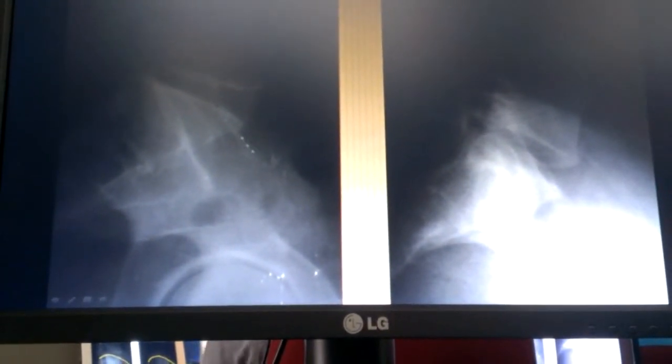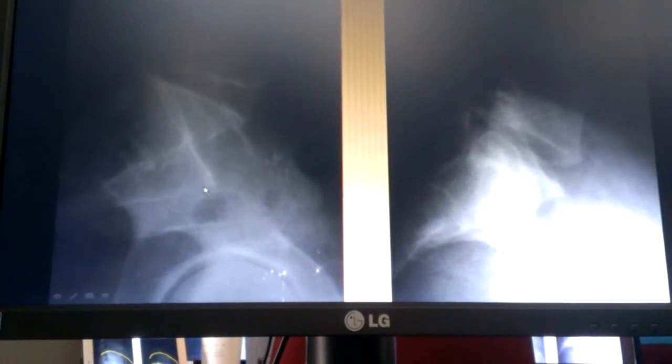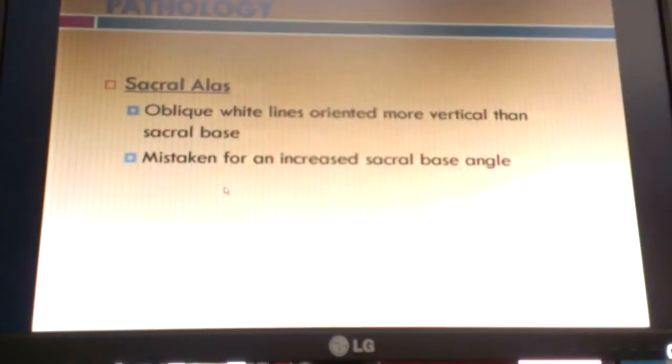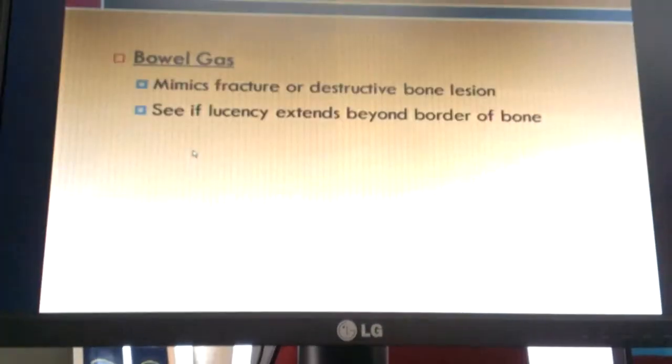I tell you why. The reason I'm saying that is that students are always asking me what that is. They think it's a stress fracture or something. I'm not sure. But that's just the brim of the pelvis. That's just this area. Actually, it's got to be higher because it's overlying the first sacral segment, a little bit of the body. So it's just the pelvic brim, basically.